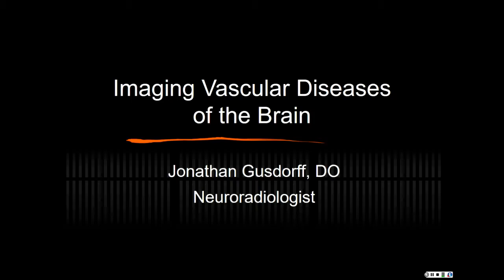So in that one case that I showed you in the first lecture, of all those blotchy areas of bright signal, it showed all that microvascular ischemic stuff, wasn't really sure what it meant, but when we pulled up the diffusion-weighted imaging sequence, that showed that one that was kind of light bulb bright, which was abnormal on flare, but it was the only one that was bright on diffusion-weighted imaging. That told us that that abnormality was acute ischemia, because diffusion-weighted imaging demonstrates areas of acute to early subacute ischemia.